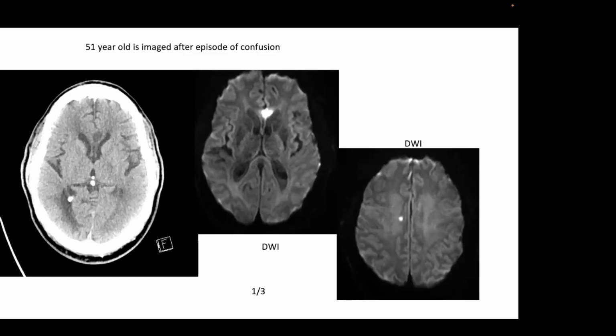What is a more common lesion in the corpus callosum? Cyst or ependymoma, some tumors, and what else? Some contusion lesion. Right, but usually we have a history of trauma. MS? Yeah, multiple sclerosis. Could be some demyelination. I'm sorry, I didn't understand that. Multiple sclerosis, maybe. Yeah, multiple sclerosis, exactly.